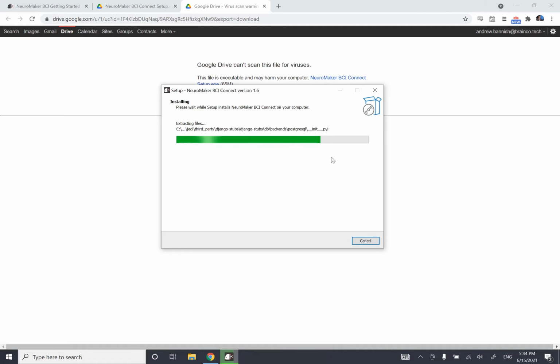Just a few more moments here. And what's very fun is actually if you use our NeuroMaker BCI full semester curriculum, you'll actually be able to use some of these packages that are being initialized here now. So we're going to go ahead and let this finish.